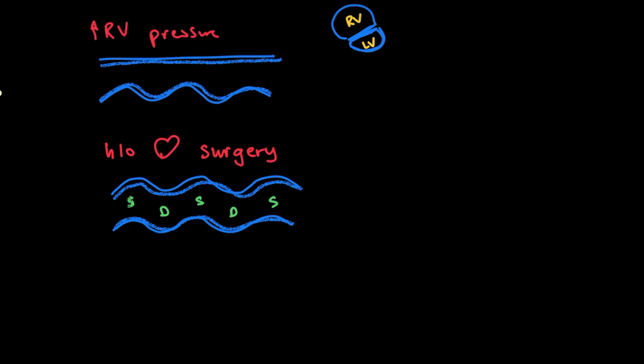What might you see in a patient with a left bundle branch block? Let me draw your posterior wall here first. What do you see with your septum? Well, you'll see that the septum actually starts moving quicker, and then it's still, and then it contracts again. So something like this.